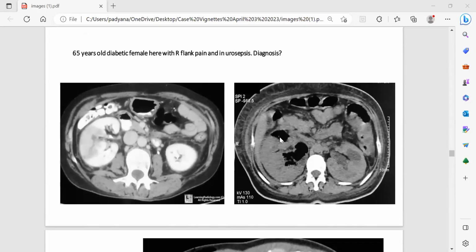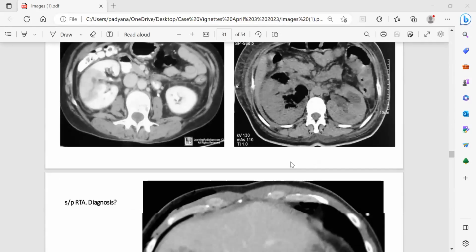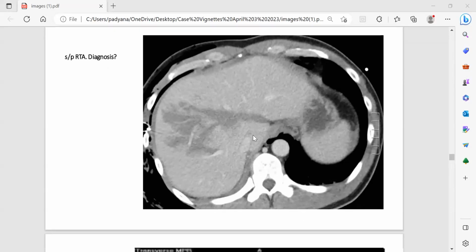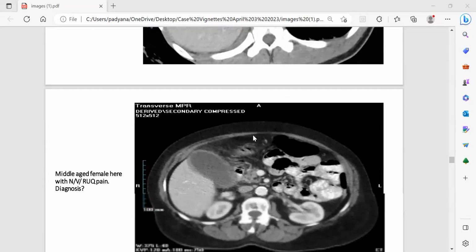Right, emphysematous pyelonephritis. Excellent. Very good. Liver laceration. So it is a high grade liver laceration. You may not necessarily need to say numbers, but anything that goes closer to the hilum or extending everywhere, or has a large blood around into the capsule, we always say high grade liver laceration. So that's a good way to start. Even if you don't say the grading, it's okay, but mostly that's what we want to know.